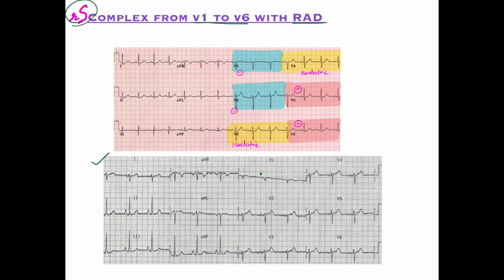So again, if you try to look at this abnormal ECG, you will see that you have deeper S waves, okay, and small R waves.